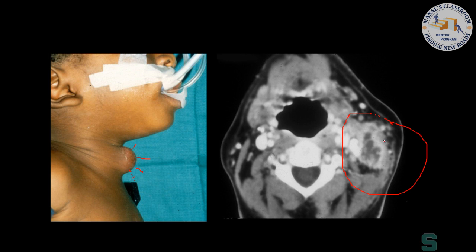So in the back of my mind now, every time I see a necrotic lymph node, especially in the United States where we have more squamous cell carcinoma than we have tuberculosis, I always have to think in the back of my mind. Here in Egypt, in the Middle East, and in South America, and in India, you already know this. But just realize tuberculosis is sometimes called the great mimicker. It can look like anything and it can occur anywhere. Okay.